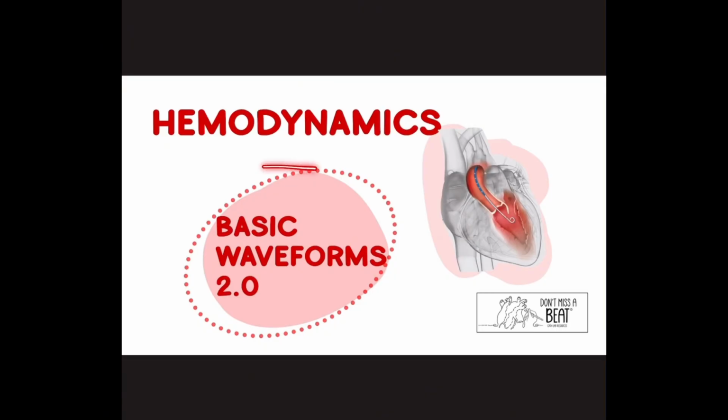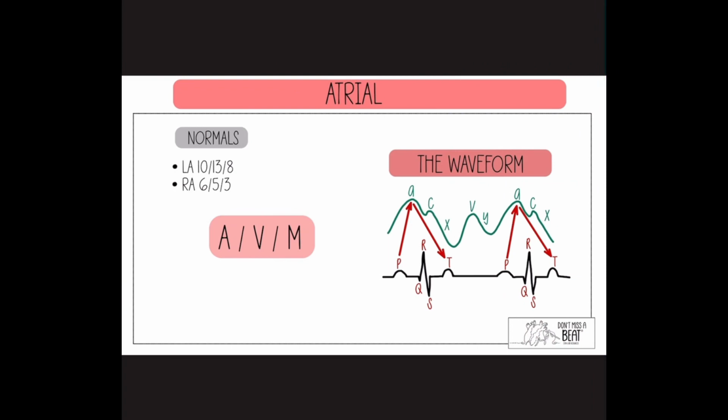Basic Waveforms 2.0, because this is a re-recording and a little bit of an update from some audio issues that I had the first time I ever started my YouTube channel. So to start is atrial.